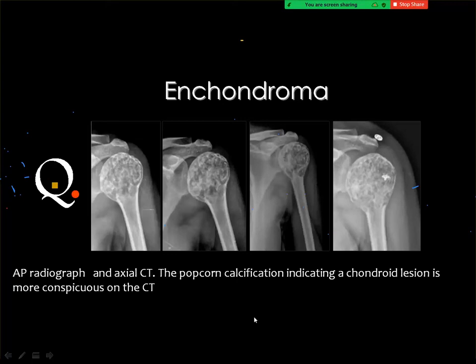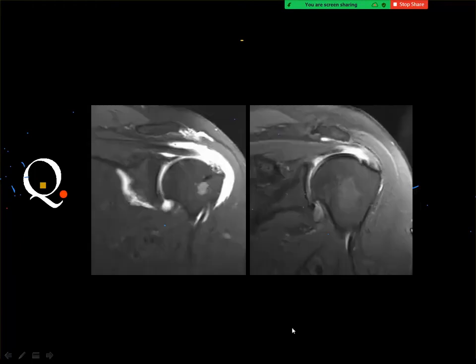Enchondroma in the long bones usually do not cause expansion of the bone, but sometimes you got this appearance. You cannot diagnose the brown tumor unless you have other evidences in the clinical or in the remaining radiographs of the presence of hyperparathyroidism. And you know that the brown tumor does not contain calcium until the patient receives therapy for hyperparathyroidism. It's a purely osteolytic expanding lesion. Next case.